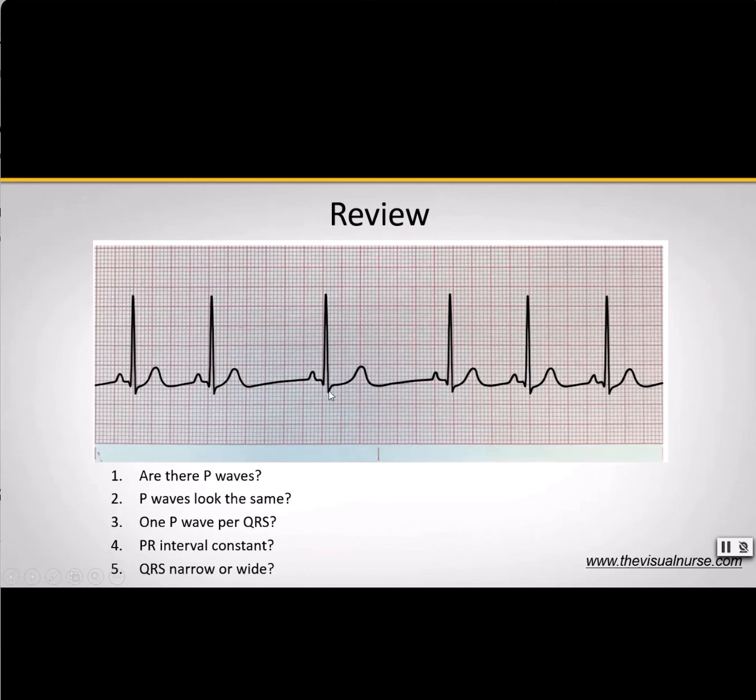Is the rhythm regular or is it irregular? It's irregular, right? These QRS complexes, notice these big tall R waves are not marching out routinely as we would expect them to. The distance between them is differing. So, this will be an example of what rhythm? Sinus arrhythmia. Good.